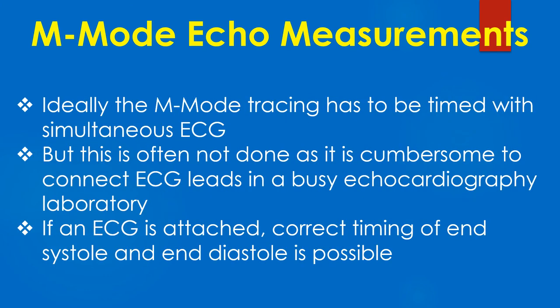Ideally, the M-mode tracing has to be timed with simultaneous ECG, but this is often not done as it is cumbersome to connect ECG leads in a busy echocardiography laboratory. If an ECG is attached, correct timing of end systole and end diastole is possible.